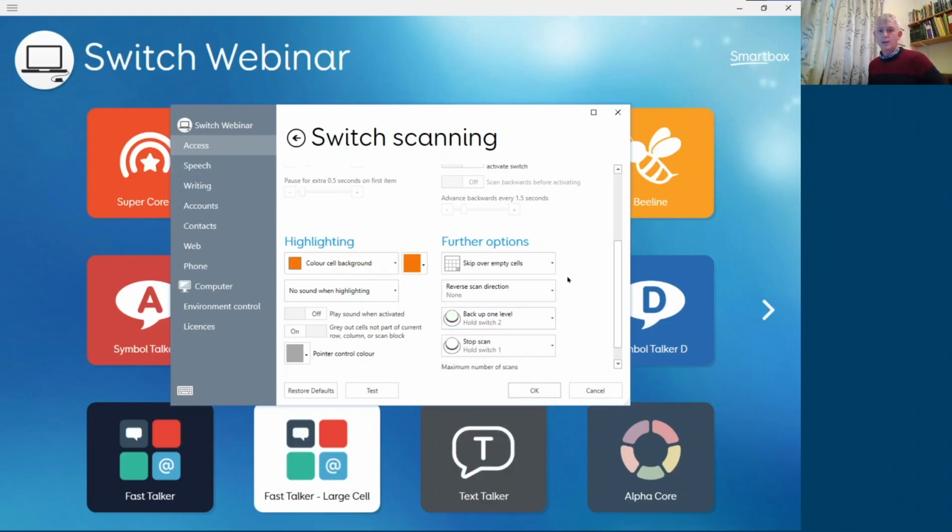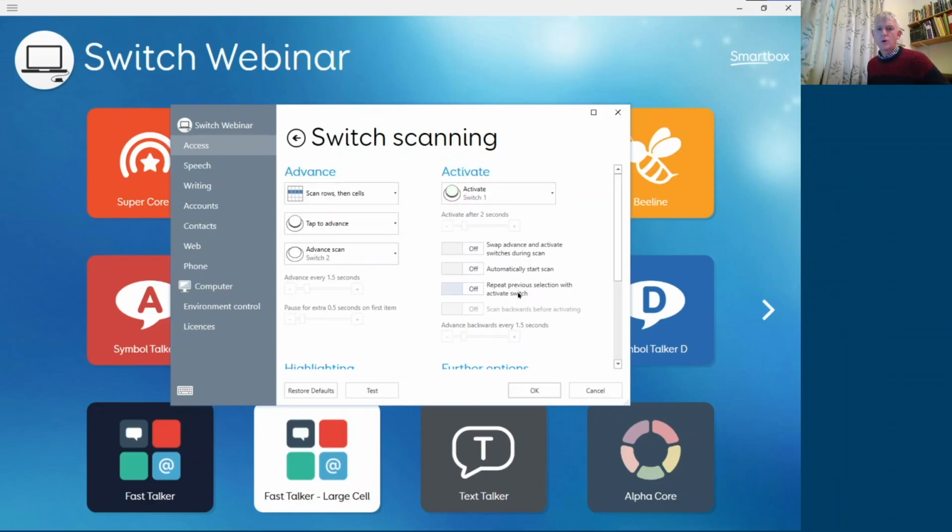So just a reminder, switch 1 and switch 2. Switch 2 now is back up one level. Switch 1 is my normal scan and switch, but I can also cancel with it. Let's just go into that and have a look.